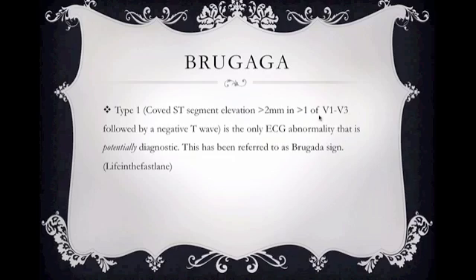It's the only ECG abnormality that we can find anyway useful, but this is Brugada's sign. All right. Another website you guys got to check out is Life in the Fast Lane, which is awesome if you want to learn about some more medicine. But if a patient has this on their EKG, they have Brugada sign. We can't say that they have Brugada syndrome because you need to do a diagnostic workup.